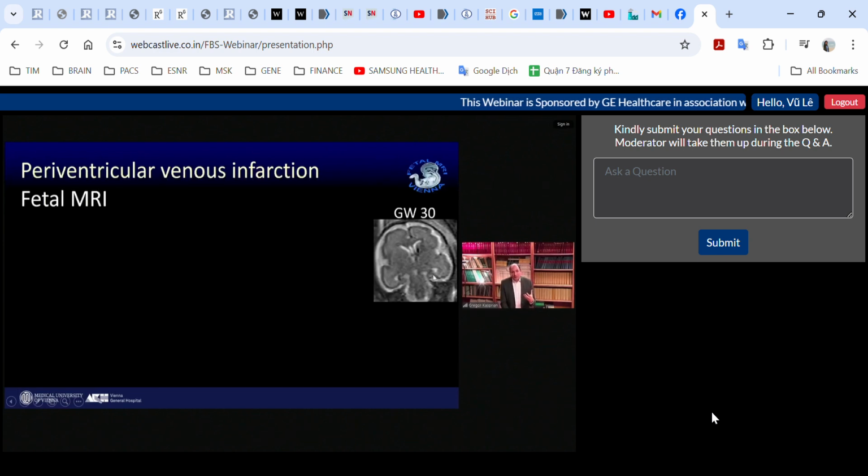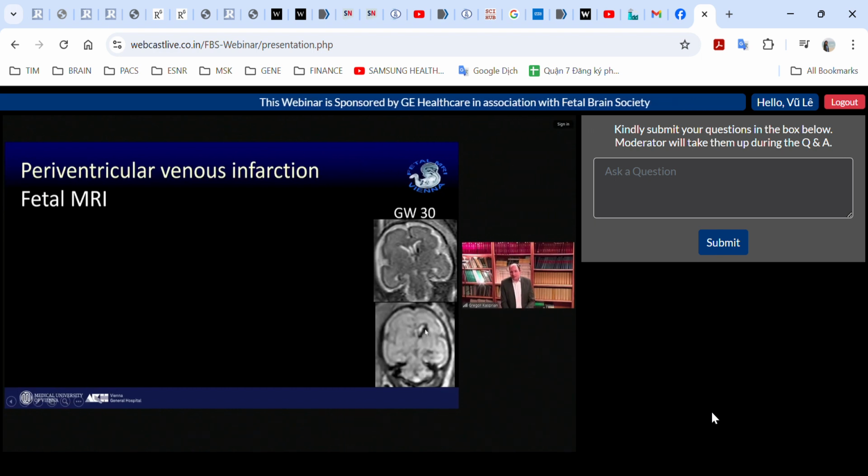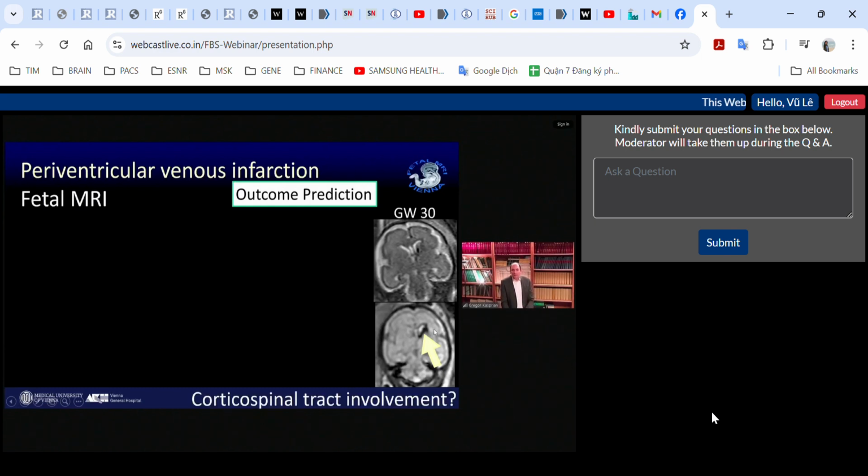Before you do that, I really recommend you do the EPI star. Certainly, you can see the extent of the hemorrhage much better here. Now, still, you don't know much. You may think that this is going to have a good outcome. I would say there is not a huge gap. But let's go to the original images of the original hemorrhage.